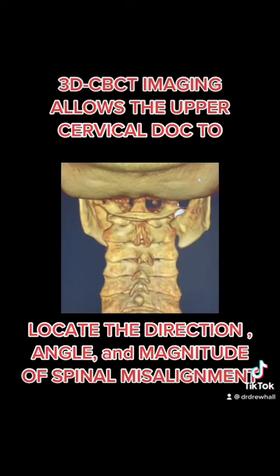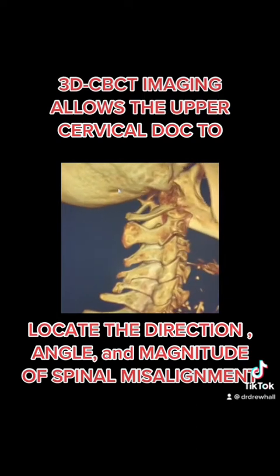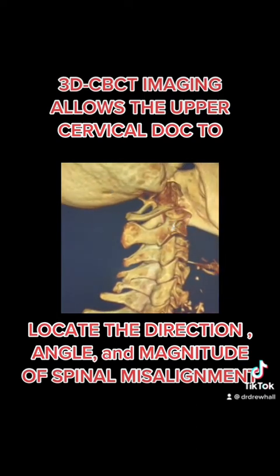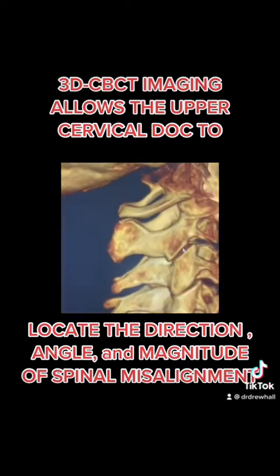It's called a CBCT. And what it allows us to do in the office is look at each individual joint. Now, where my cursor is, this is the second cervical vertebra, this is the first cervical vertebra. You can see very clearly on this joint right here, this is where my cursor is. That's the undersurface of the C2 joint, and this is the undersurface of the third cervical joint. And you can see the back edge of C2 joint is backwards compared to the back edge of the third cervical joint. And you can see the front edge of the axis, or C2, is backwards of the front edge of the third cervical joint.